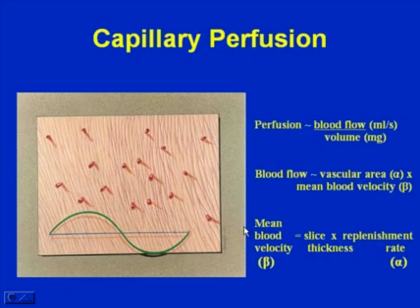Now it became clear that with color Doppler we were in fact not seeing the capillaries that are integral in the tumor angiogenesis process. In order for us to get a Doppler signal, a lot of these small capillaries would have to be flowing at the same time, 100 or more, to give a Doppler signal.